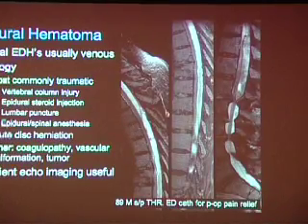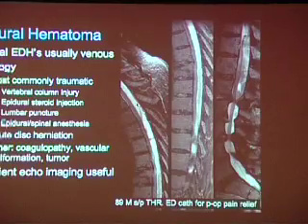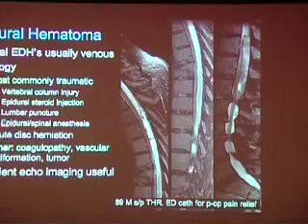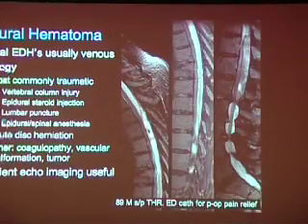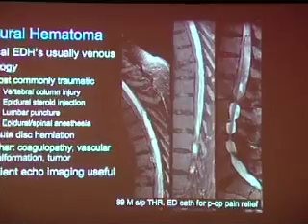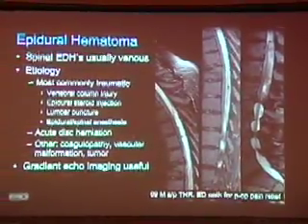Well, his vertebral column actually looks pretty good, except for some old injuries, but here's his spinal cord in the upper thoracic region. Here's his nice subarachnoid space, and then all of a sudden we see this dark line. What is that dark line? Okay, that's the dura. Okay, so on MR, we can see the dura. So the dura is being displaced by this large multiloculated collection, which is severely compressing this elderly gentleman's spinal cord.